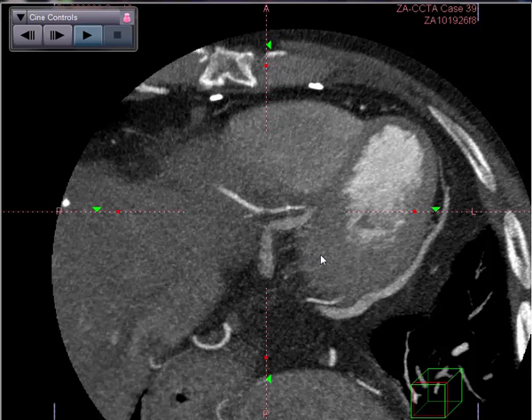We cannot rule out any clear stenosis of significant extent in the area of the takeoff of the free radial graft from the aorta. So we have several areas of concern, and this patient probably would be better served by going directly to coronary angiography and better defining these areas, and the potential for intervention in one or more of these bypass grafts is quite high.